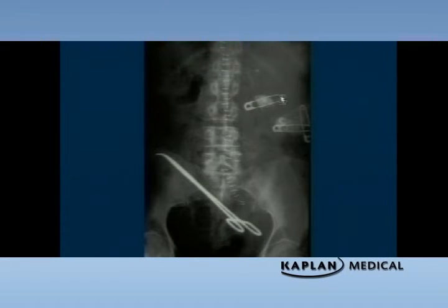These are safety pins on the outside of the person, because we know we don't get inside the body and hold the bowel wall together with safety pins. But we do put clamps in there. And that's why it is often common that after abdominal surgery that a patient gets an X-ray before they leave the table to make sure that we haven't left any wedding rings, empty beer bottles, cans, clamps, loose change stuck inside the patient's abdomen. Now, can you see the top of the diaphragm?